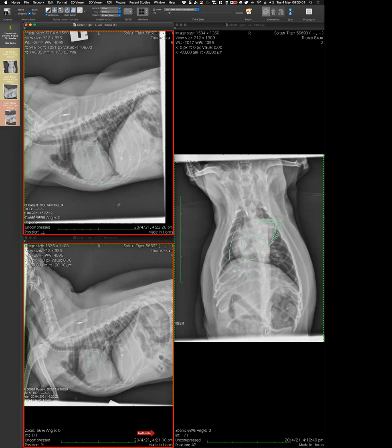Yeah. Excellent. So your comments are excellent. I wonder if there's anyone taking part of what you said and moving forward. Because out of everything you said, in terms of the findings, I agree with almost everything. I disagree with one of your interpretations. Okay. One of the things included. And then if we put that correct, then we kind of untangle the problem. So is there anyone, so I can summarize the findings.